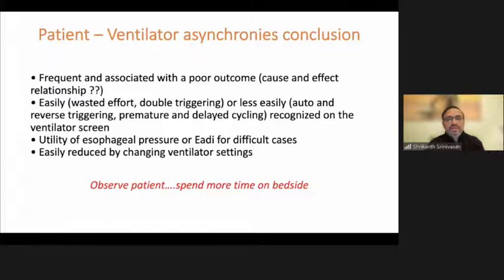But one has to take steps to overcome this asynchrony based on the condition of the patient, at what stage of the ventilatory cycle the patient is in. Is it the initiation phase, the maintenance phase of the ventilation, or during a weaning phase? And the steps have to be directed accordingly. The bottom line should always be to make sure harm is not caused to the patient.